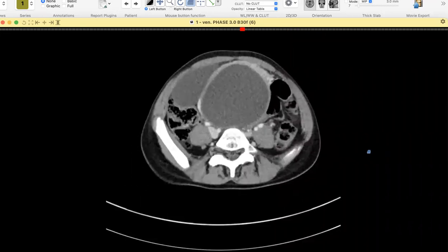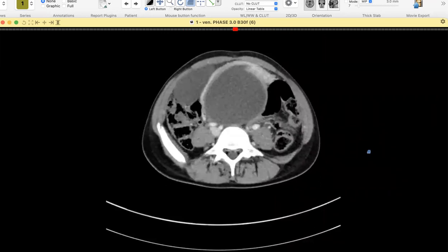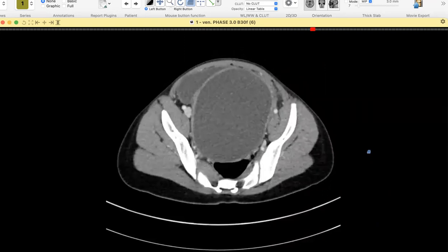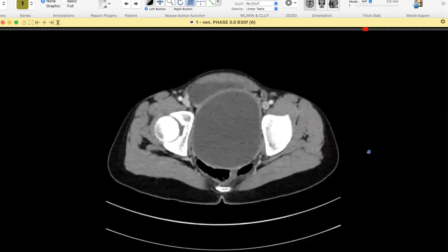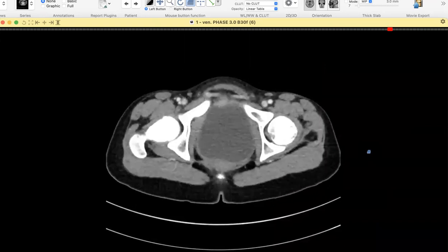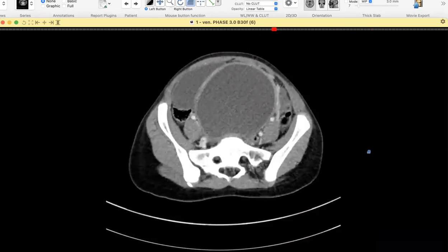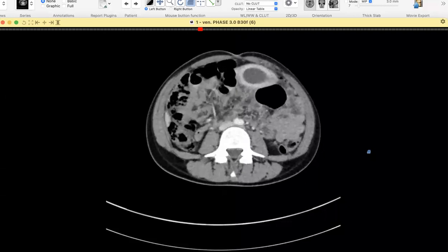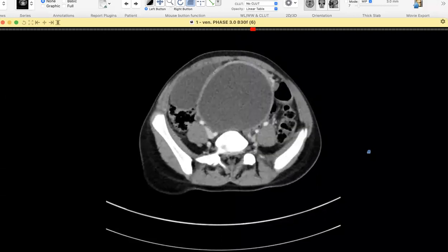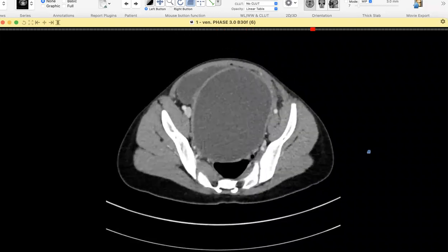So it could be an ovarian cyst, a massive multicystic ovarian cyst, and with fever, because one of the cysts looks infected. The inflammatory markers are not significantly elevated. She has mild fever. But I can see a cystic structure with a ring enhancement around it, where there is a rounded enhancement.